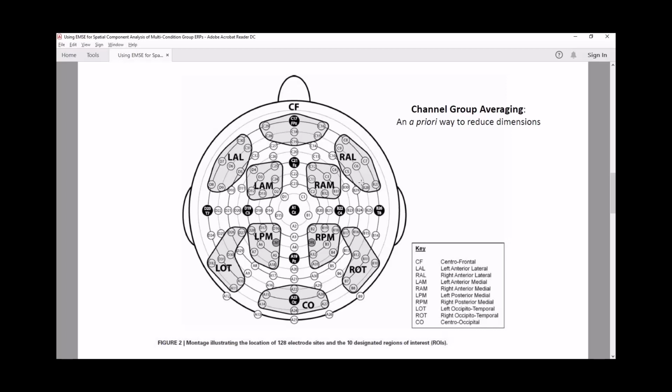As you know, spatial component analysis, or spatial PCA, is a straightforward data reduction technique which finds the fewest number of components to preserve a given percentage of variance of the data. However, each component is orthogonal with all the others, and this is not a natural physiological constraint. Consequently, the number of data space dimensions is reduced, but each individual dimension may not have physiological meaning.